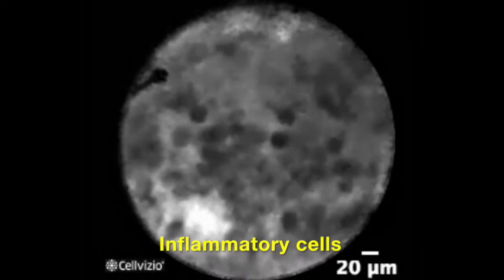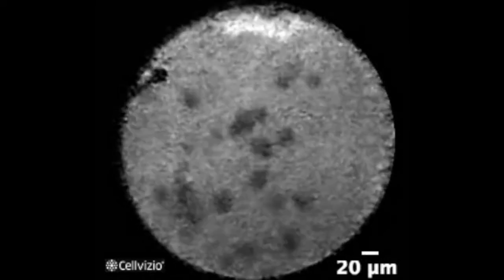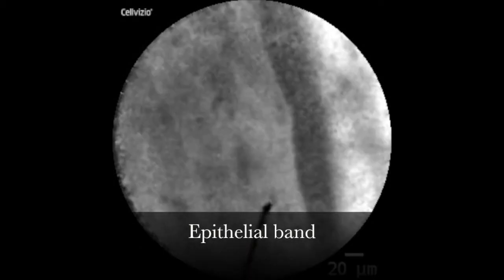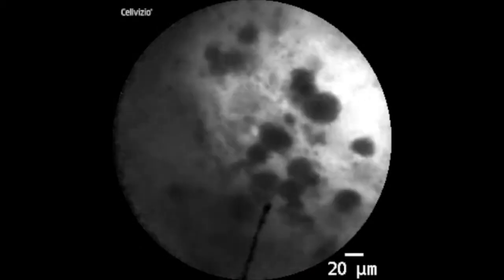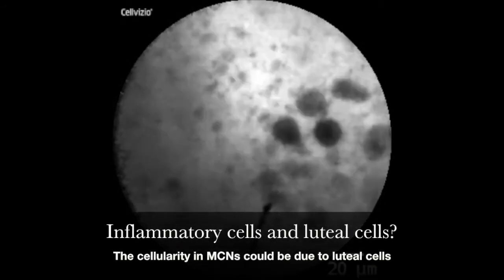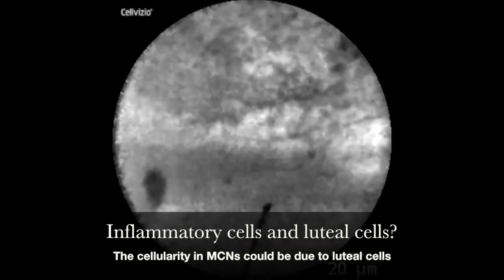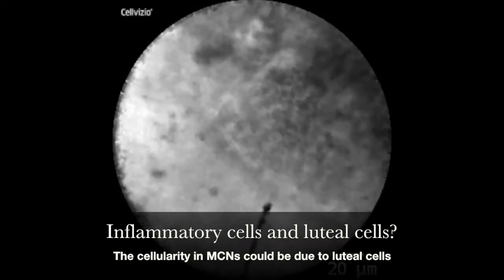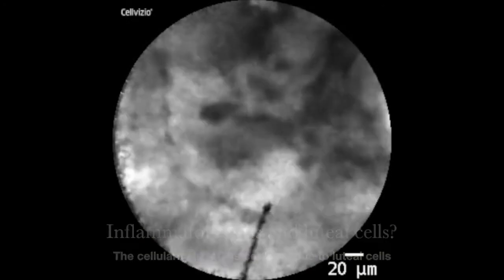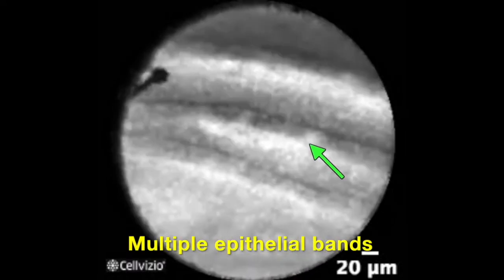The inflammatory cells could be seen in clusters or groups. Again, another example of epithelial band in mucinous cystic neoplasm. Occasionally, we see these large, round, isolated cells, which we think are luteal cells, which are a feature of the ovarian stroma. This is hard to prove, but MCNs demonstrate both these large cells and clusters of clumps of inflammatory cells.